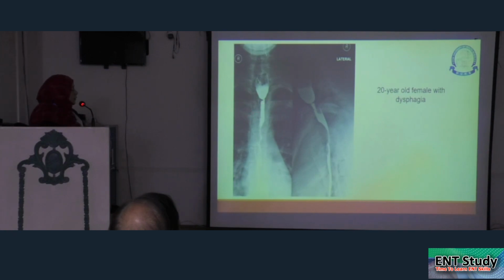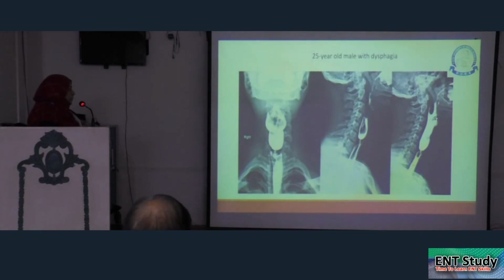There is a radiolucent ring in the hypopharynx with a proximal dilatation and hold-up of the contrast. This is in favor of the esophageal web. However, opacification of the distal esophagus is noted, so it is causing partial obstruction. When there is a partial obstruction, the jet effect is also noted on the fluoroscopy.